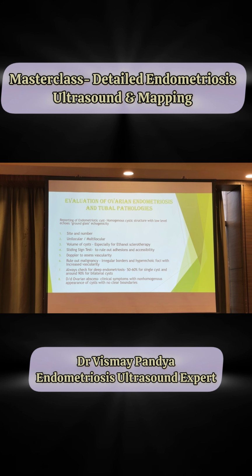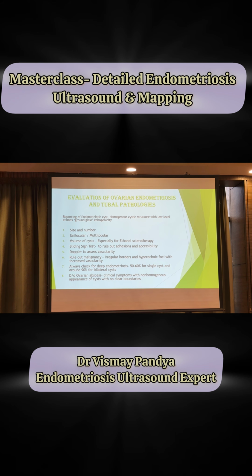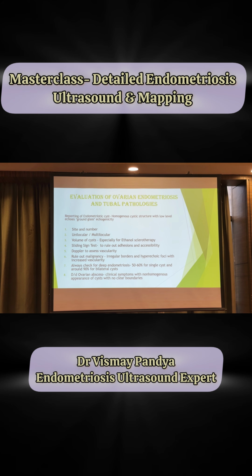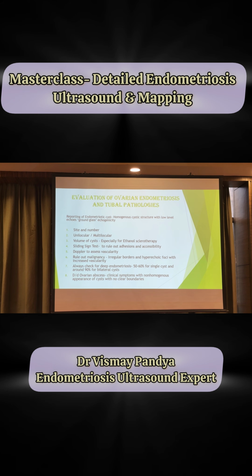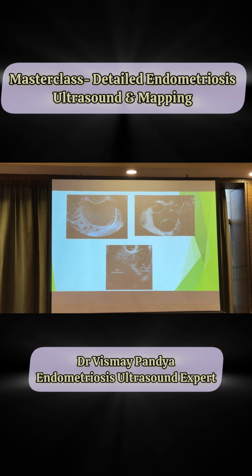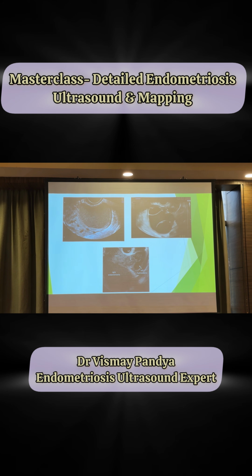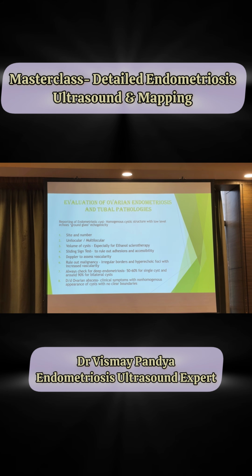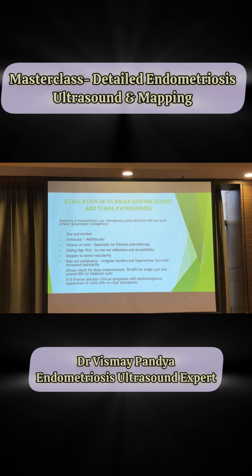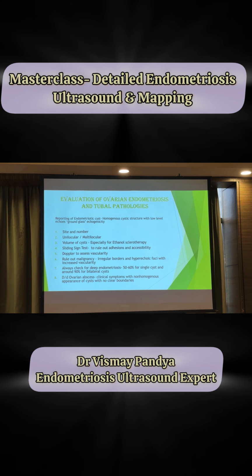to add is you need to know the volume of the cyst. Why the volume? Because especially at our unit we have started doing something called ethanol sclerotherapy. In ethanol sclerotherapy, as you can see in the next slide, there is this unilocular cyst with no other deep endometriosis, with good AFC, with no other pathologies. You can do this therapy, and the volume of the cyst will tell you how much ethanol needs to be injected in that cyst.